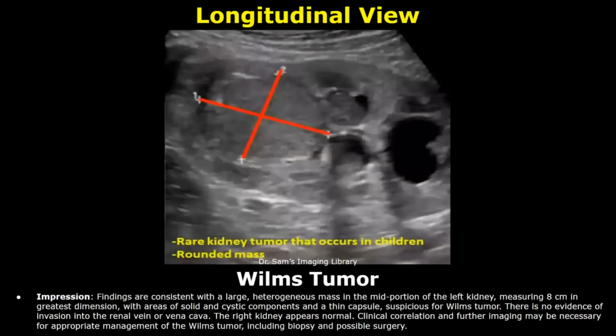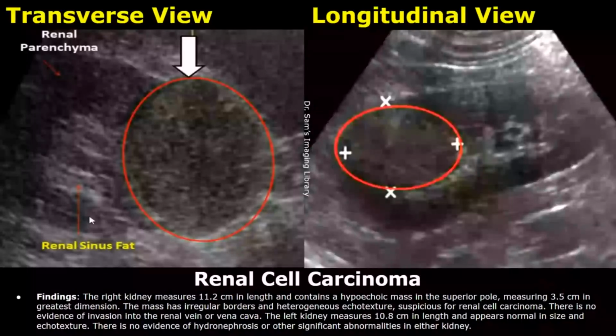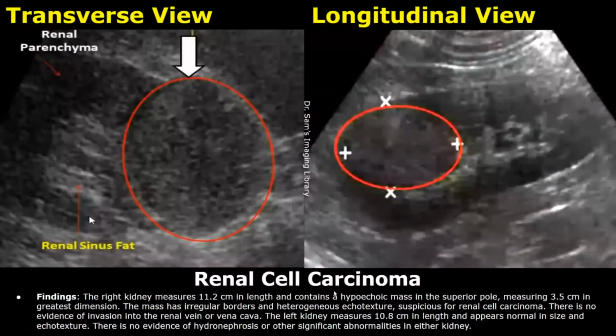The findings for renal cell carcinoma usually include a hypoechoic mass with irregular borders and heterogeneous echo texture.